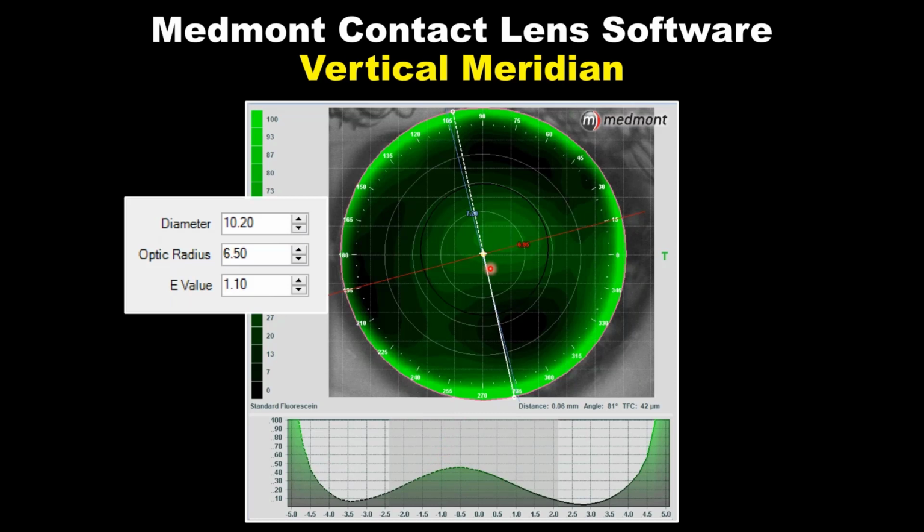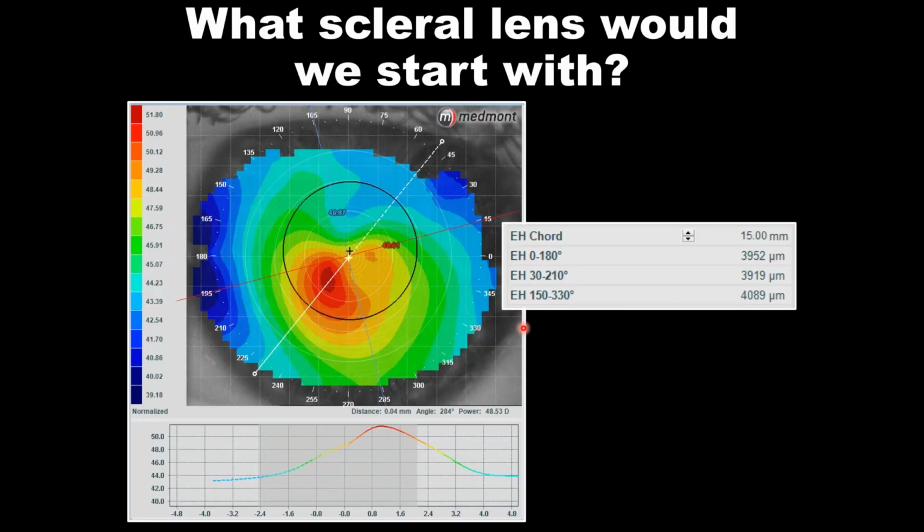We may not have the ideal tear pump, but I do feel confident that the lens has these beautiful 3 points to land on and distribute its force and be stable and hopefully be centered. So I'm thinking corneal GP appears like it has a good shot. The elevation map is telling us there's 123 microns of differential. That's well below our threshold of 350. And the contact lens software is saying the lens looks very confident. So for this patient, corneal GP would be the way to begin.